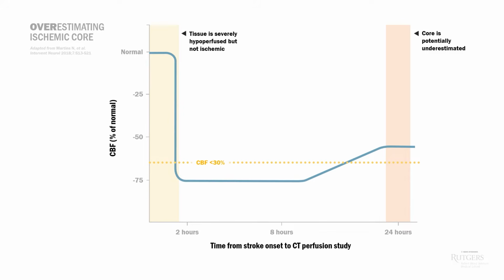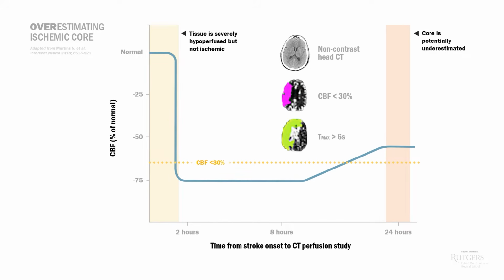Well, patients with unknown stroke onset were allowed in those trials. Let's say a patient presents with symptoms on awakening, last known well was at bedtime 9 hours ago. That patient comes to the emergency department and gets the following scan. Large core, large penumbra, no mismatch. Patient is not a candidate for intervention, right?